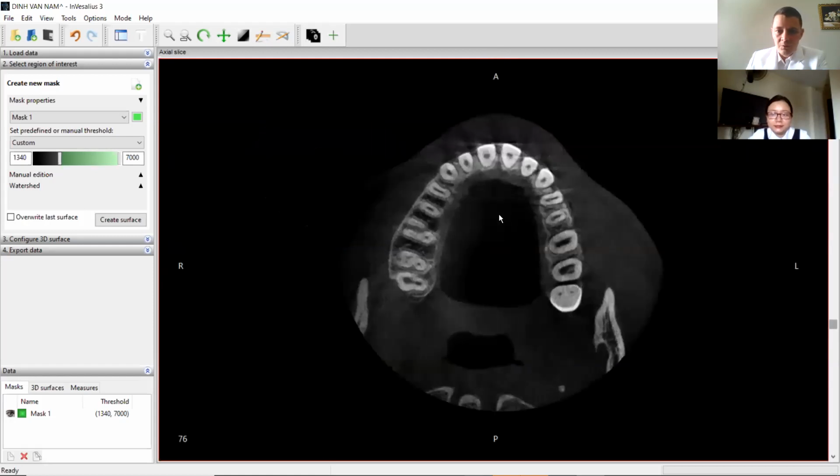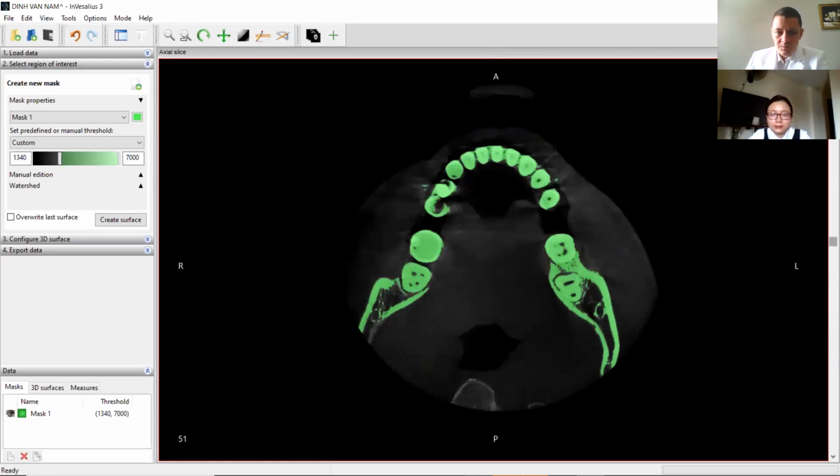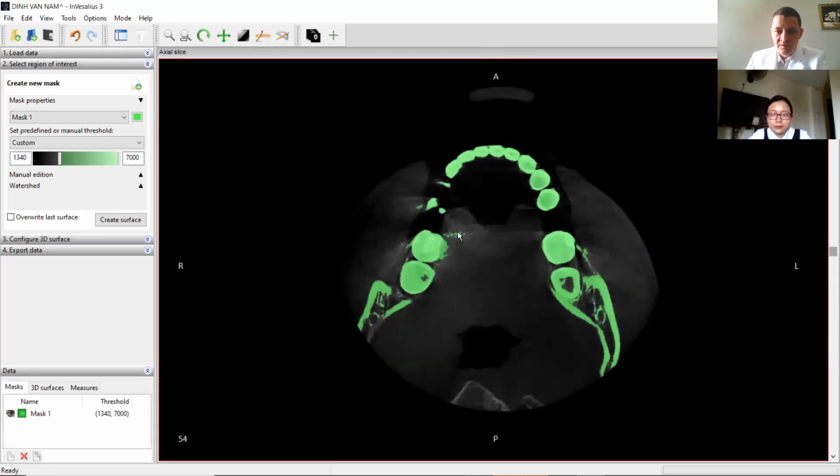Okay, so here I will work like this. So here I want to remove this.